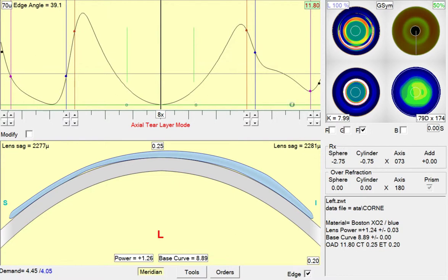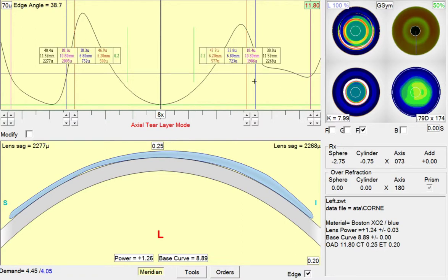And we're a little bit past. And we're right at 1986. Perfect. So now we are 20 microns flatter, or 20 microns less sag, here at the back edge of the reverse curve with no sagittal change here at the edge. So it looks like there's more clearance at the lens right here, but I think this is just the nature of how the display works. I recommend just going by the sagittal depth of the lens and making sure that number lines up.